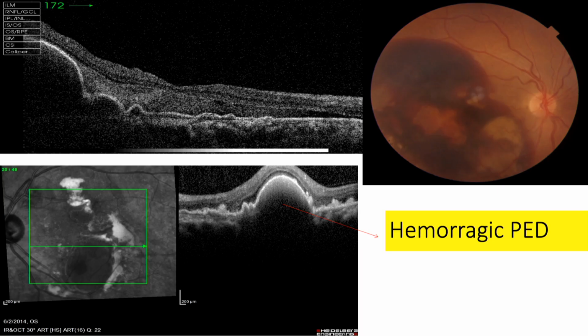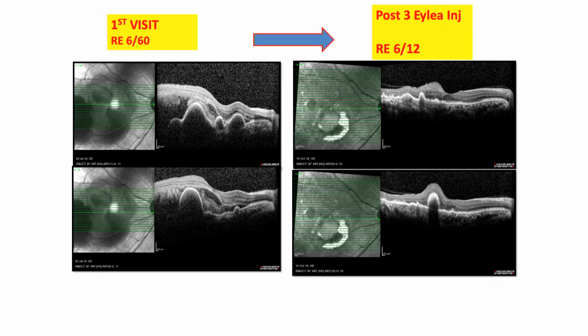Again, one more OCT finding is a hemorrhagic PED with intraretinal hyperreflectivity and backshadowing. This is a hemorrhagic PCV. If the subretinal thickness of the blood is less than 400 microns, the study conducted showed that with intensive anti-VEGF monotherapy without gas displacement, patients can have good vision like this if treated early.